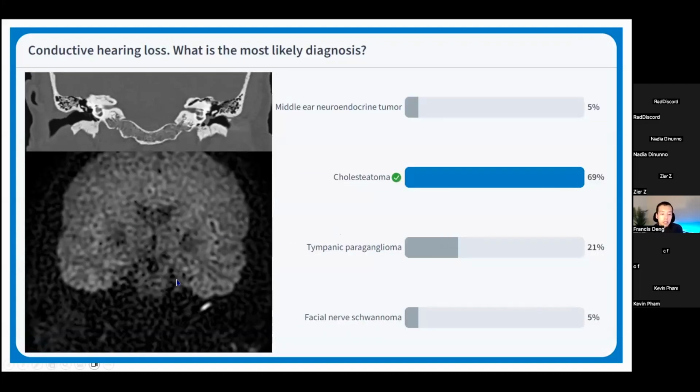Okay, what kind of image is this? This is a coronal DWI with a PROPELLER method, which is a non-echoplanar imaging technique to perform diffusion weighted imaging. And it is showing high signal intensity in this abnormality that on CT appears as opacification of the middle ear cavity. And so when you see something very bright in the temporal bone on a non-echoplanar DWI image, you're going to think immediately that this is a cholesteatoma.